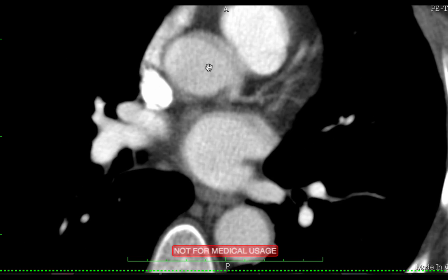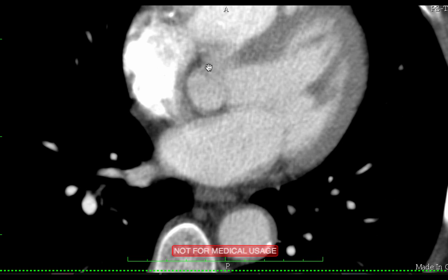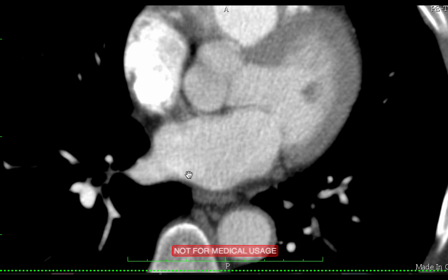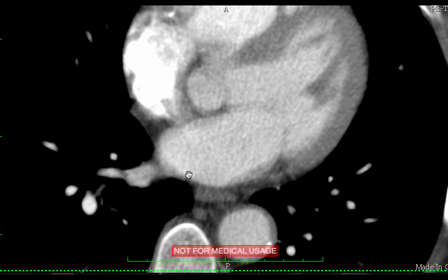But that runs into a little trick here because that means you've got these sliver thin little valve leaflets, and the full force of the left ventricular myocardium is pressing against them and doing everything possible to cause them to flip backward into the left atrium, which would be disastrous. And that can happen in some people if they've had a heart attack that affects the protective mechanism here.